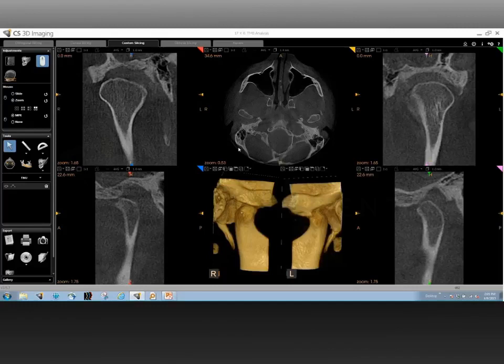See, Jordan, one of the biggest advantages of having bilateral anatomy on a single screen is that you're able to compare and contrast both the condyles of the same individual at the same time. And that is very essential when you evaluate a joint that is not a single joint, that's actually a dual joint, so to speak. So one of the few things that you can look for, apart from the anatomical landmarks, is the smoothness of the surfaces of the condyle and of the fossa.